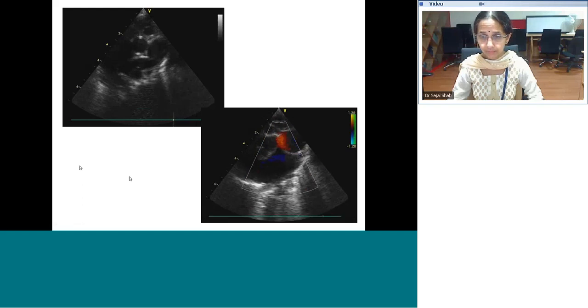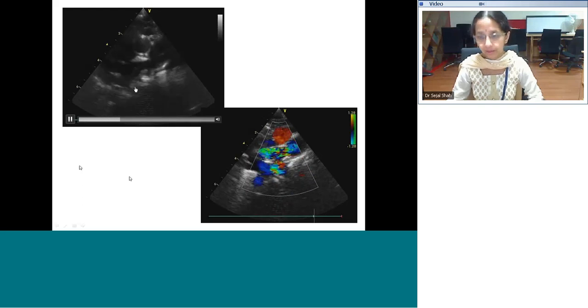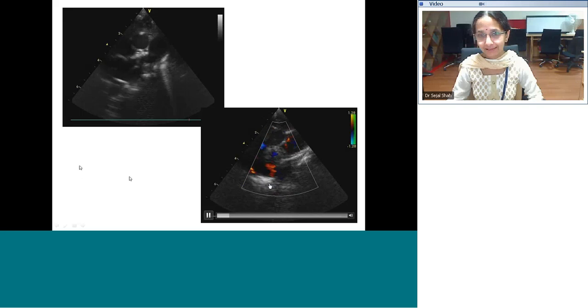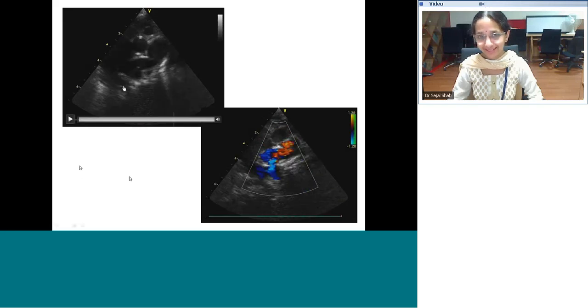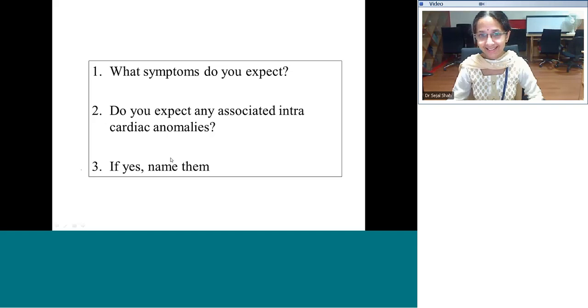The left pulmonary artery. There's something wrong with the left pulmonary artery? Stenosis. Okay. Yes. Anything other than stenosis that you can see? That's very nice. You feel it's the right pulmonary artery to LPA. LPA from RPA. Yes, correct. So now let's look at the questions. Yes, LPA sling. So the diagnosis is actually that this child had an LPA sling.